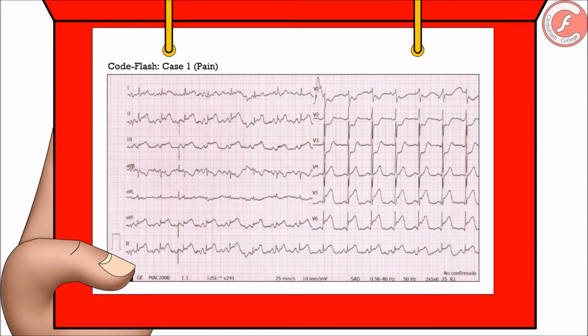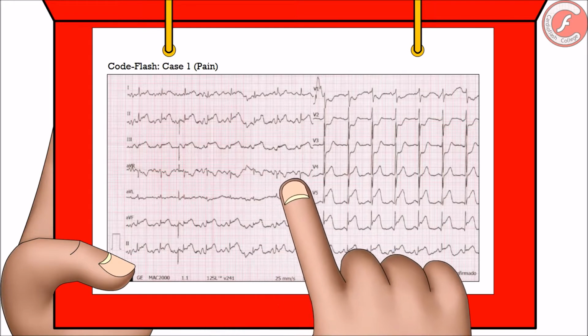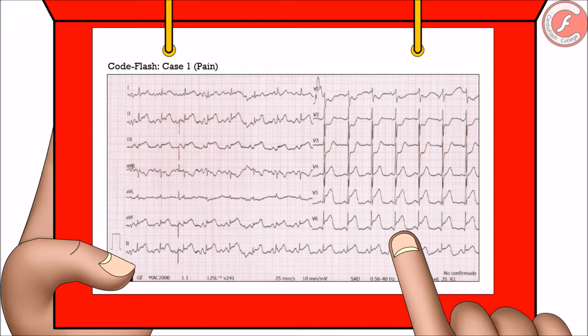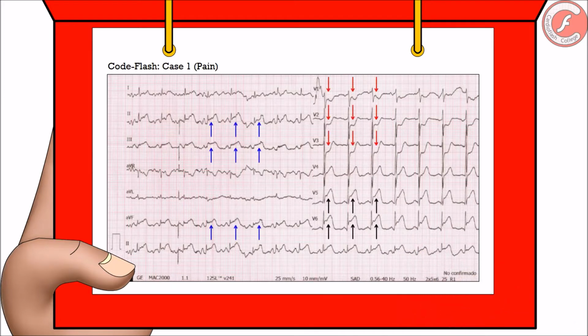That's it! In this electrocardiogram, we have an elevation of the ST segment on the inferior and lateral leads, with a mirror image descent of the ST segment on V1 to V3 leads. This tells us that we have a subepicardial or transmural type of acute myocardial lesion on the inferior and lateral walls of the left ventricle, what is known as inferolateral STEMI.